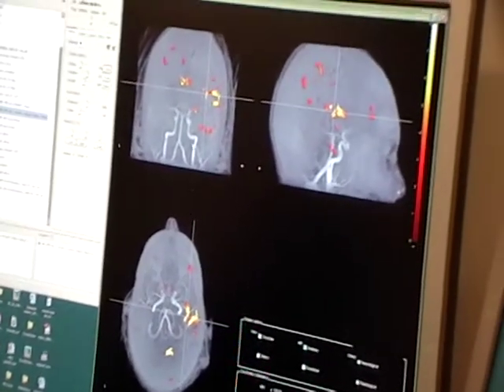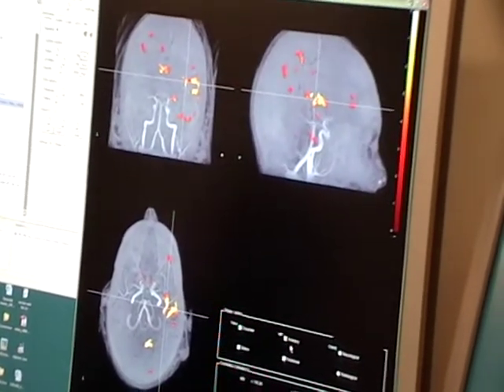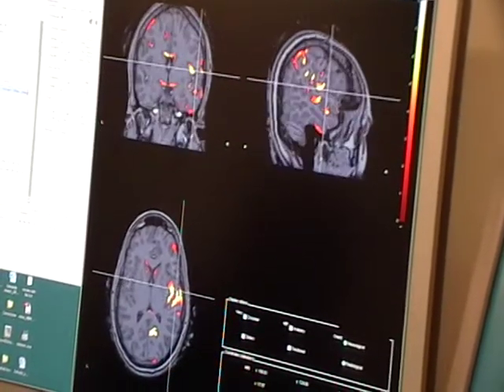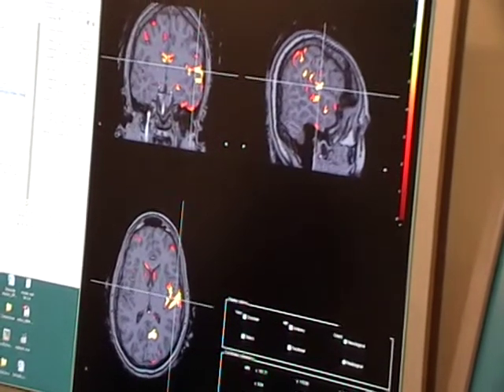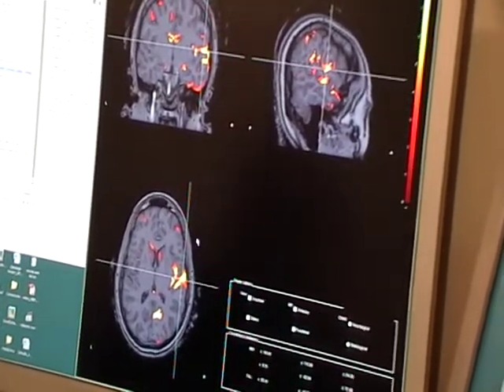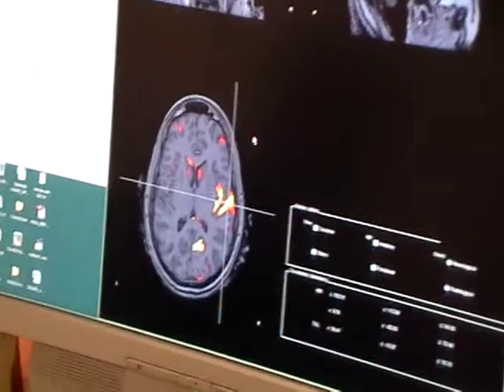What you see here is an orthogonal view of the patient's head, and we can virtually remove the scalp using some image analysis software and go straight to the brain areas that are of interest. Here in different colors we can easily pick up the hotspot of the recurrent epileptic activity in this patient's brain. Once again, the very important and crucial part in the information provided by MEG is time.